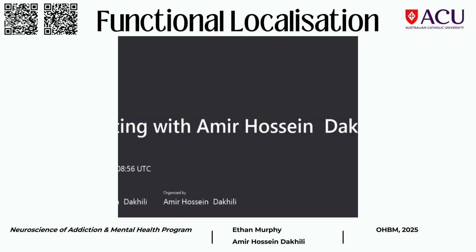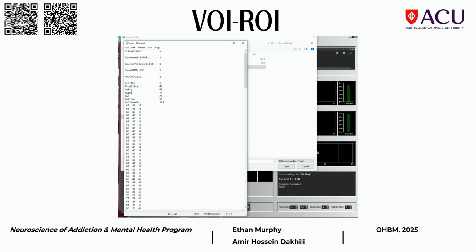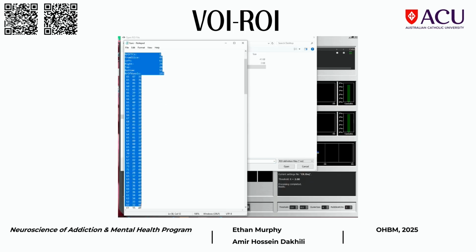Let's just go back. Yeah, the idea was to copy those MNIs, but maybe just take another look and see if there might be an issue.